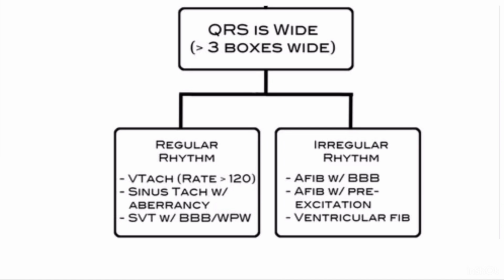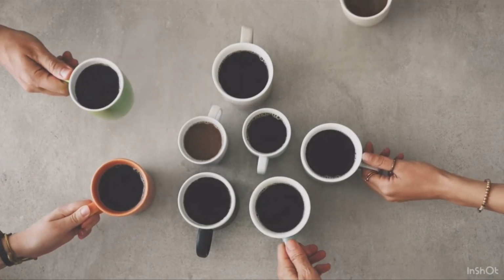Grab your EKG ruler, some caffeine, and let's decode these rhythms together with 12 EKGs one by one.